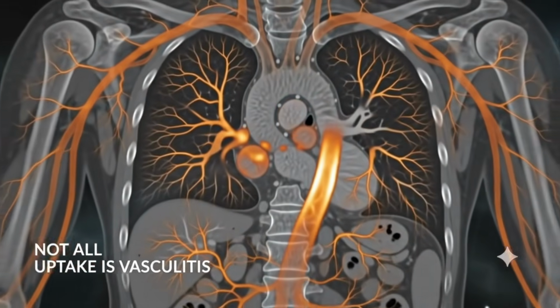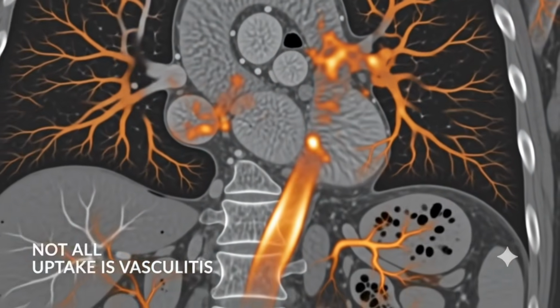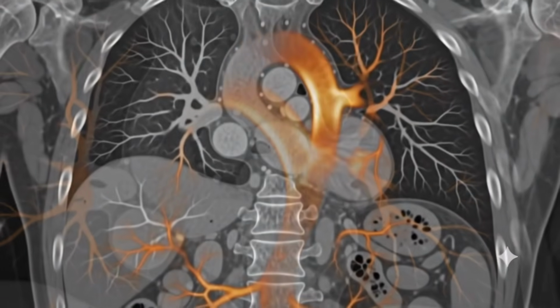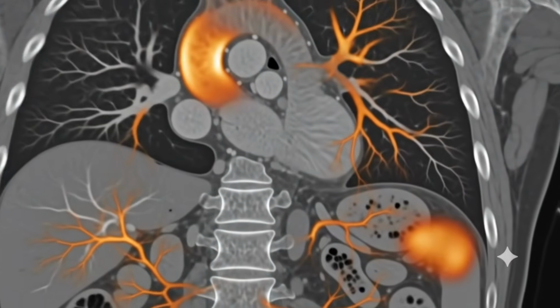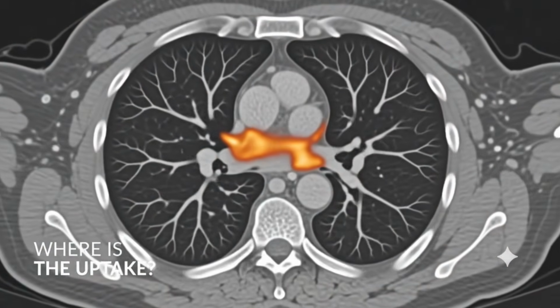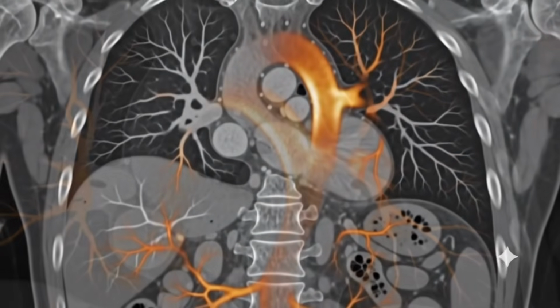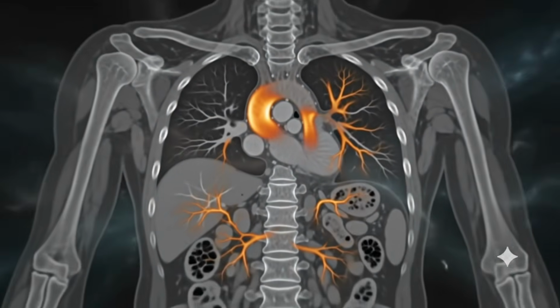But beware the pitfalls. Atherosclerosis and adjacent physiological uptake can mimic vascular inflammation. Anatomical correlation and the uptake pattern are essential. Physiological activity in the heart, muscles, or other adjacent structures may appear close to vessels. First, localize the uptake, then interpret the pattern.